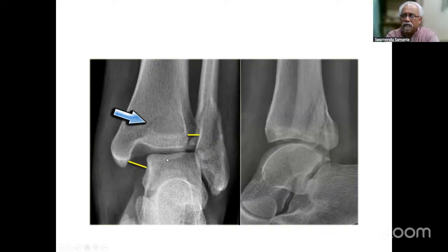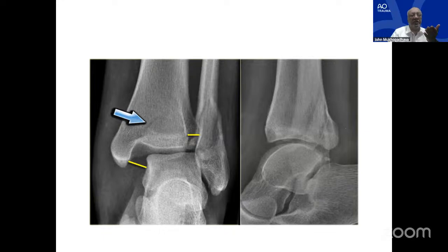So this sort of ankle X-ray we regularly see in the casualty or the emergency department, and obviously we will definitely ask for the whole length of the limb, but for the sake of discussion, I have put just this much. So anybody can answer, don't be afraid. Just tell me one by one the findings that you are seeing in this radiograph. I think you should go step by step. If you look at this X-ray, what do you see? Simple as that.